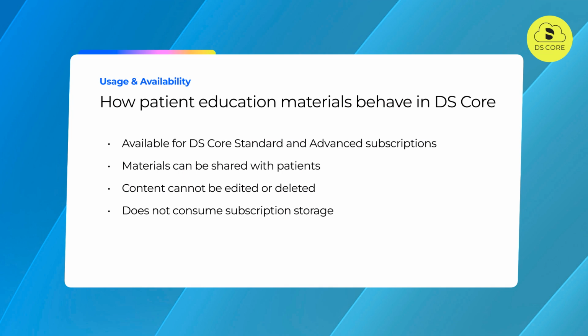Shareable with patients. All materials can be shared with patients via DS Core. Cannot be deleted. Even if removed from a canvas, the material always remains available in the library. Library is not editable. You cannot upload additional media to complement the preloaded education content yet.